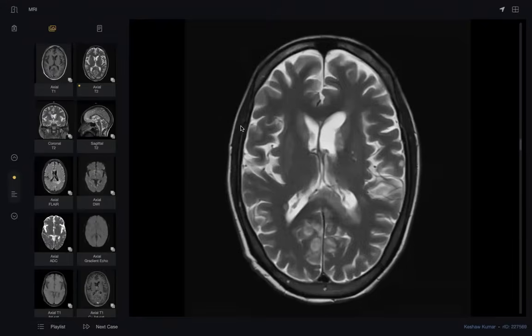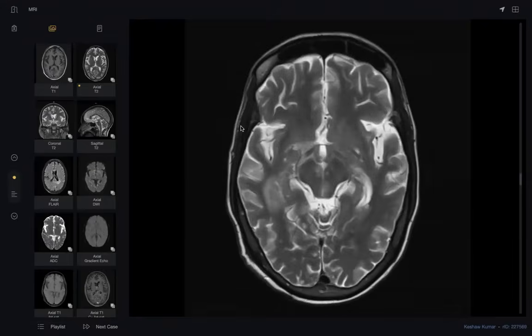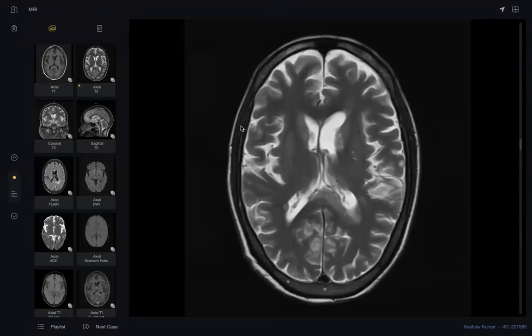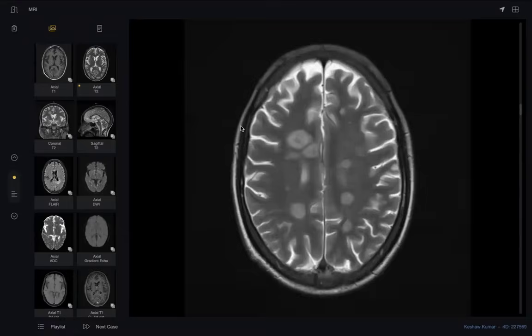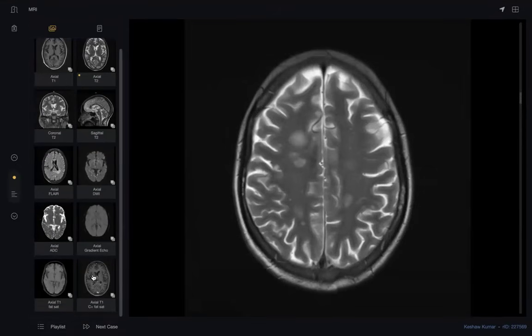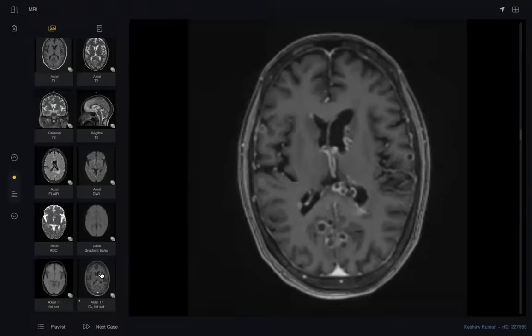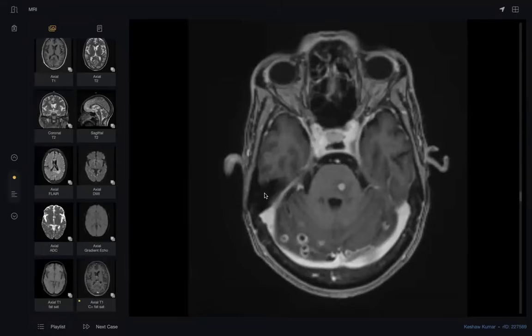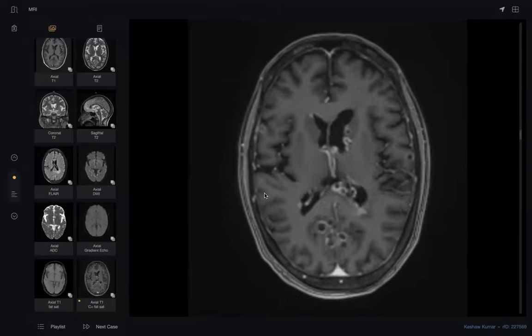Give me other differential diagnosis. She told us maybe metastasis, cysticercosis. What else? It could be multiple tuberculomas. Okay. We need to look for the post-contrast image to differentiate between these lesions. Yes, I think this is a post-contrast. Because it could also be multiple abscesses.